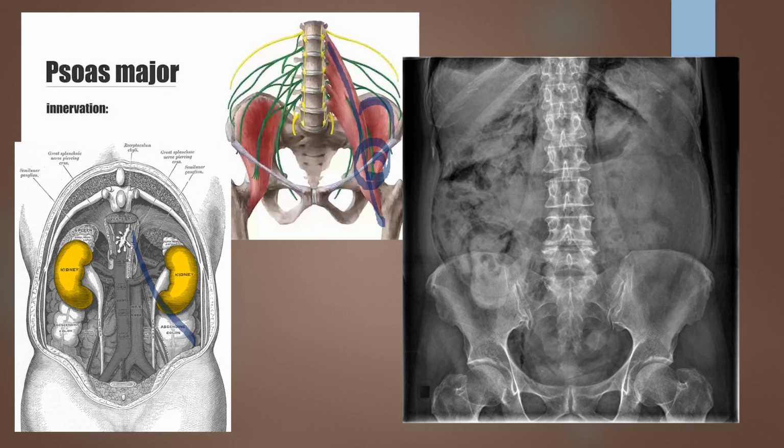Over here, you can look at this and actually see something right off the bat. This is a colostomy. This circle here represents an attachment for a colostomy bag. So this patient has had bowel surgery, and rather than emptying their bowels through the rectum, their bowels are now emptying through that colostomy bag.